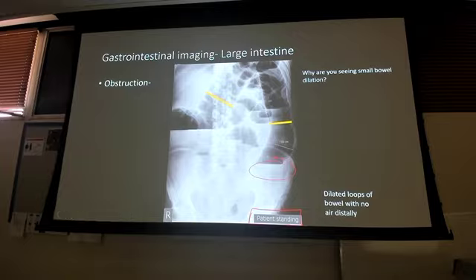Okay? And look, we're starting to affect my small intestine here. See the difference here? See the valvulae conniventes and the way the loops come across? Same thing here, another loop coming across. Valvulae conniventes and some air fluid levels. So these are air fluid levels. This is your transition point from your obstruction. Everything proximal to it, starting to dilate. Distal is collapsing, still a little bit of rectosigmoid air. But this would be your large bowel obstruction causing dilation.